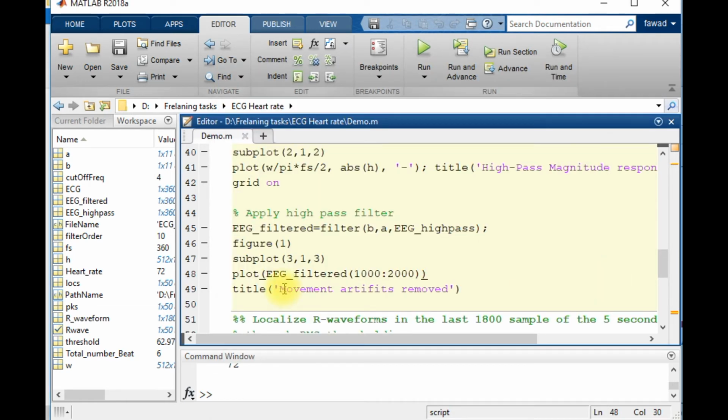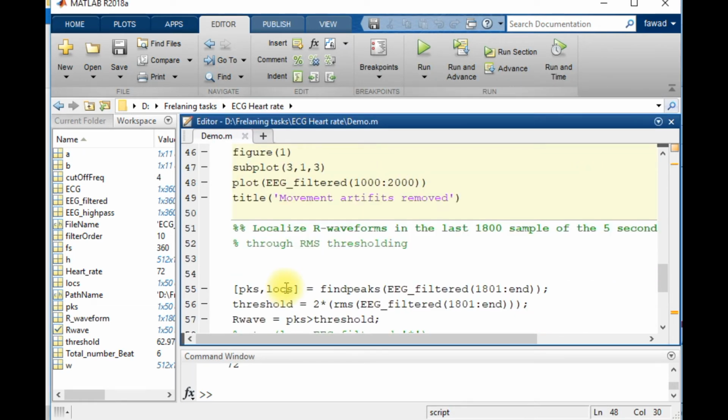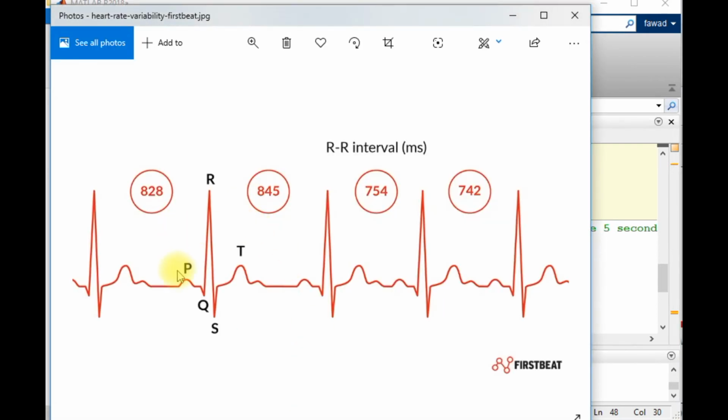After that, in order to identify the cycle, I have localized the position of the R waveform within this complete set of waveforms in one cycle. I have focused on this waveform, which is a peak.